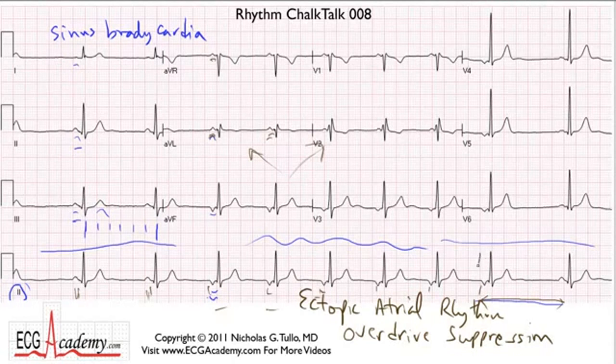But when the ectopic atrial focus stops firing, then it takes a little while for the sinus node to kick in again, because of overdrive suppression of the sinus node. We see this commonly in sick sinus syndrome, where you have a tachyarrhythmia and then post-tachycardia pauses, the common cause of lightheadedness in patients with tachy-brady syndrome.